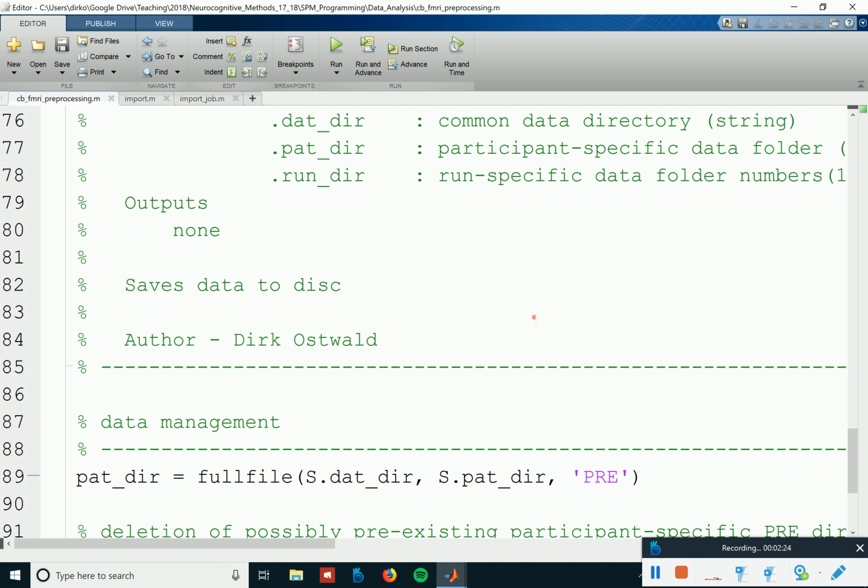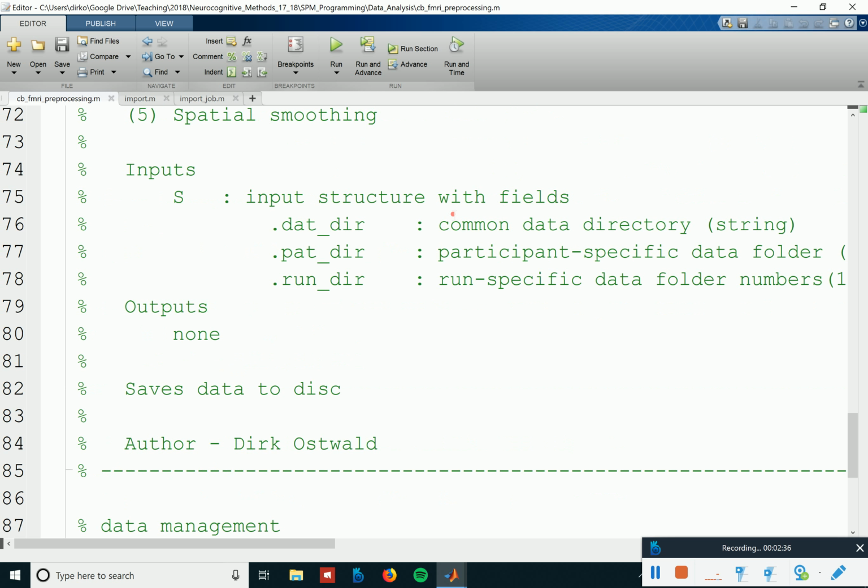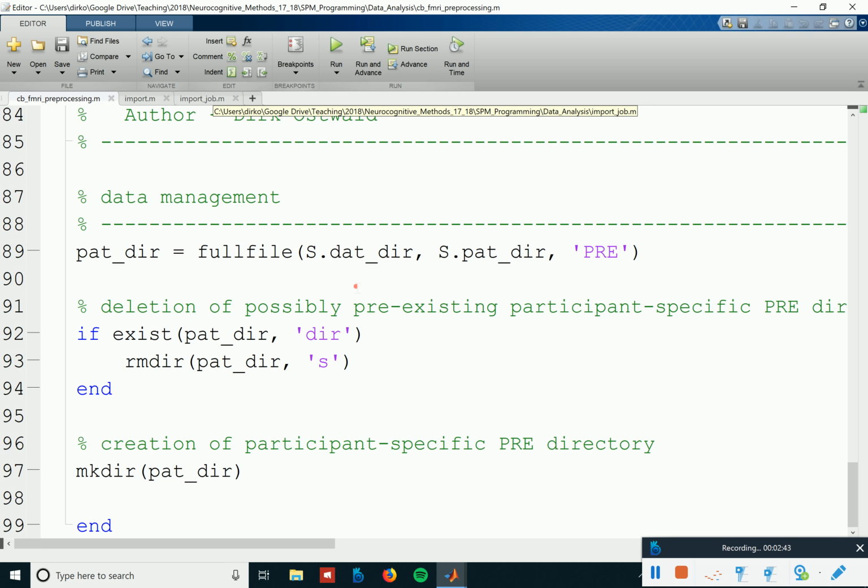If you're working with a scanner in Berlin, it's likely that you have the DICOM format, because here we primarily have Siemens scanners, but they need to be transformed to NIfTI nevertheless. So it's essentially the same step. So then let's continue here, and how do we do that?